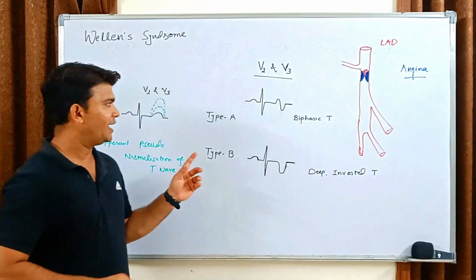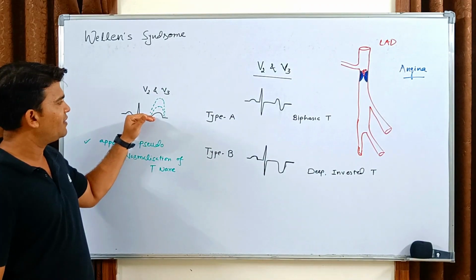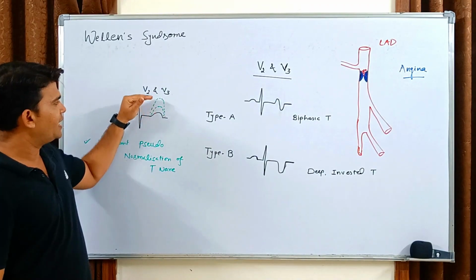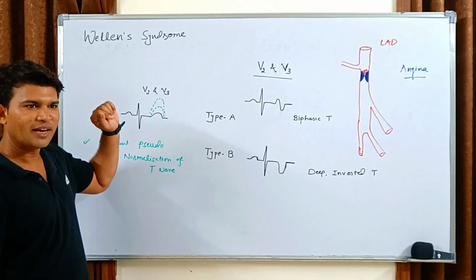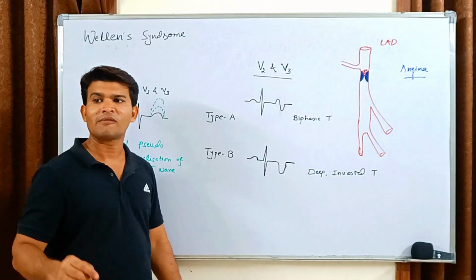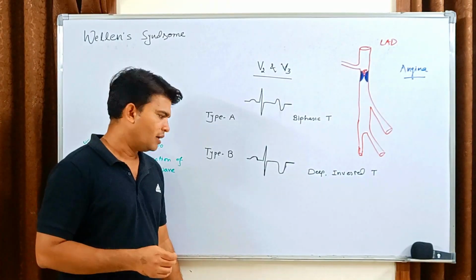And at that time, if full infarction is developed, then you will see hyperacute T wave, and the ST segment is getting elevated along with the T wave, right? And in a condition with severe chest pain, the patient is having a typical sign.